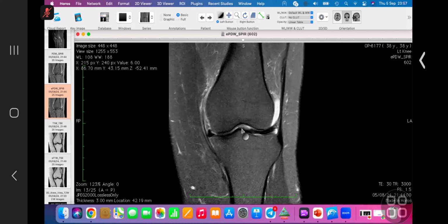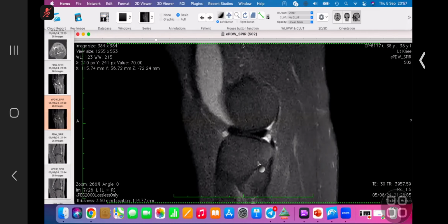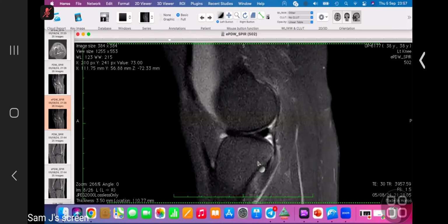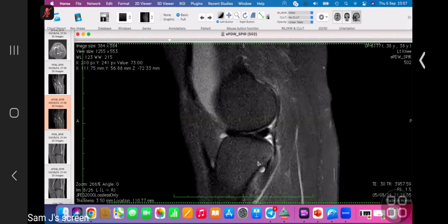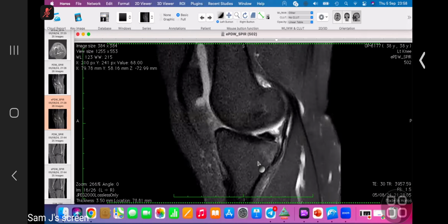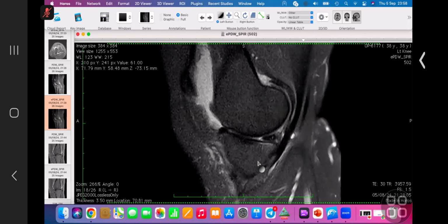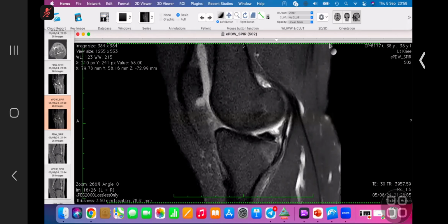So usually in these cases, meniscocapsular junction disruption presents with ACL tear. And then I assess the lateral meniscus or the posterior horn, looks normal. So, quadriceps tendon and patellar tendon appear intact. Yes. All right. So I just want to show a small PPT.